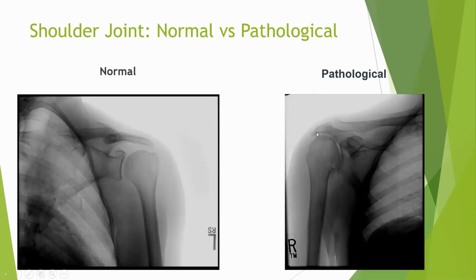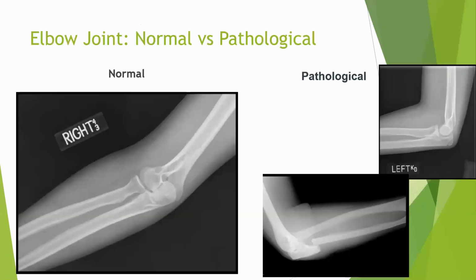Look at the acromion border or edge or corner. There are osteophytic changes, osteophytes hanging in there, making it more hooked. The more hooked the acromion is, it is for sure evidence of subacromial impingement or anterior shoulder pain and pathology. So please be aware of the acromion position, the subacromial space, the glenohumeral joint space, and the AC joint in shoulder pathology. These are the key features that you need to be aware of.